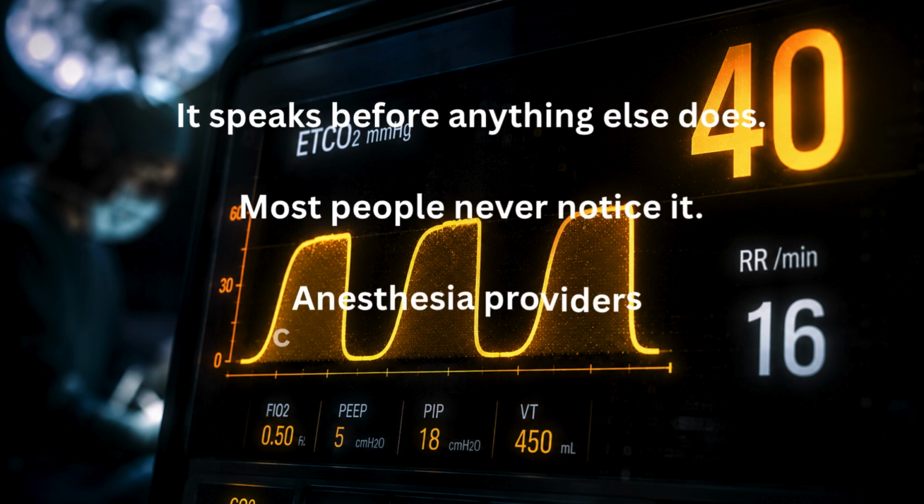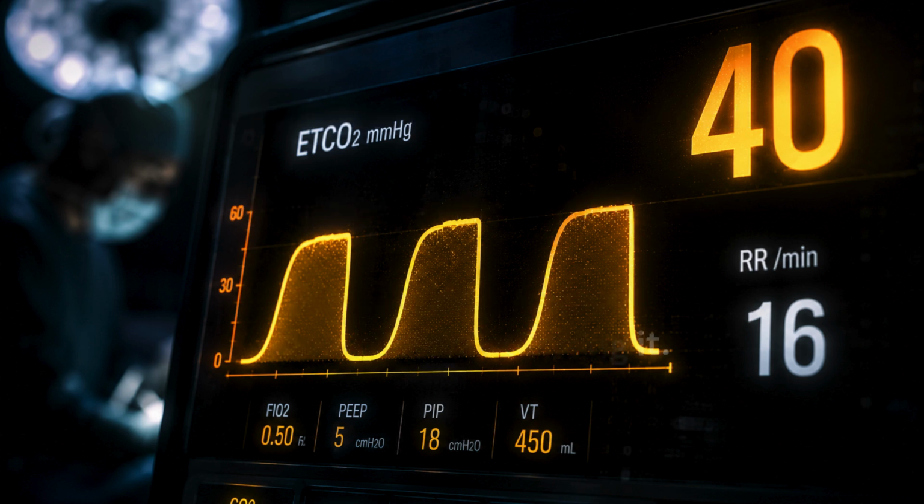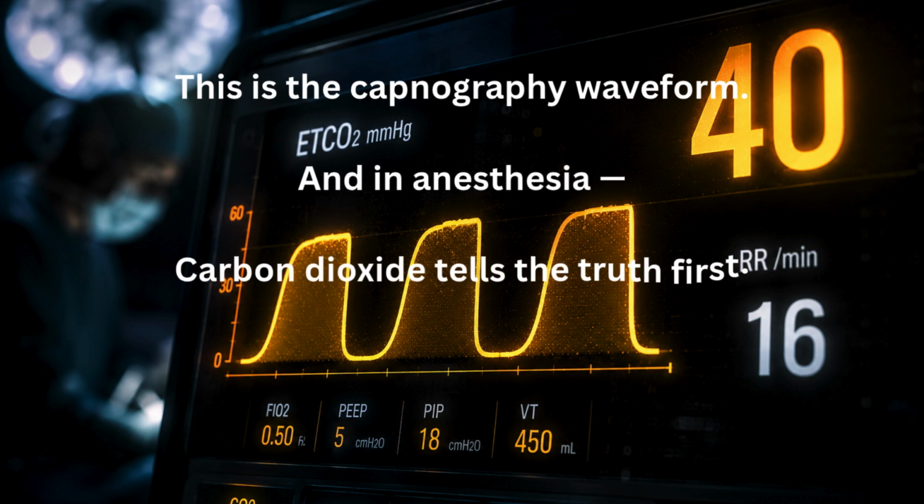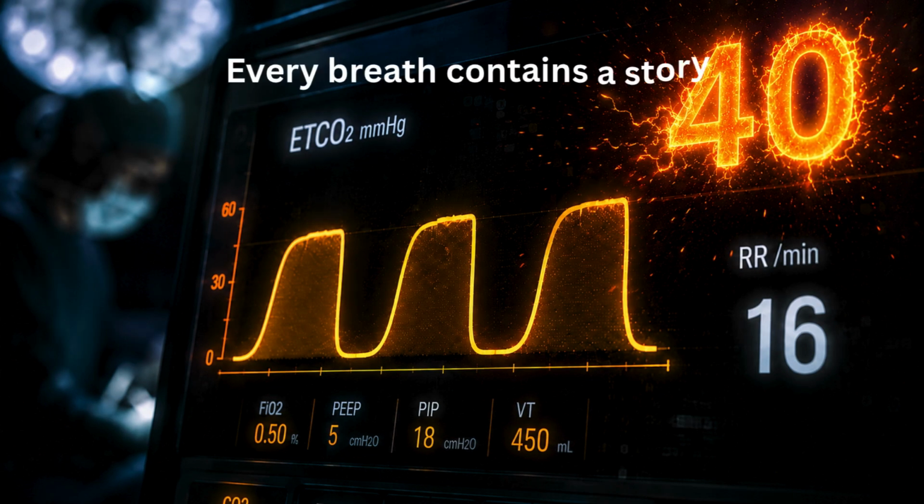Most people never notice it. Anesthesia providers cannot stop watching it. This is the capnography waveform, and in anesthesia, carbon dioxide tells the truth first. Every breath contains a story.